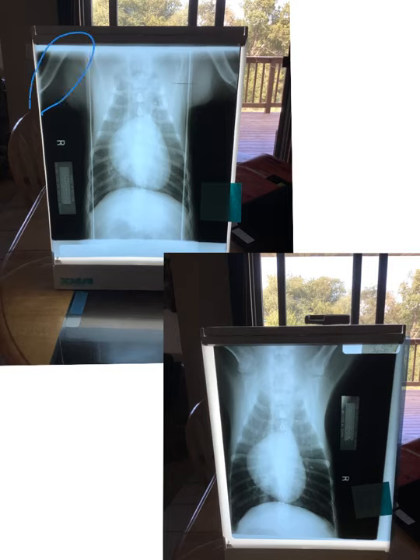So here, you guys see the forelimbs pulled not cranially, they're just sort of kept in a natural position. What I want you guys to look at here, comparing the two, is what the thorax looks like in this region. So here we have all this musculature around the scapula and the shoulders superimposed in the cranial part of the thorax. That makes this look really kind of underexposed in here. Doesn't have great contrast, and it's hard to see the details of what's going on.